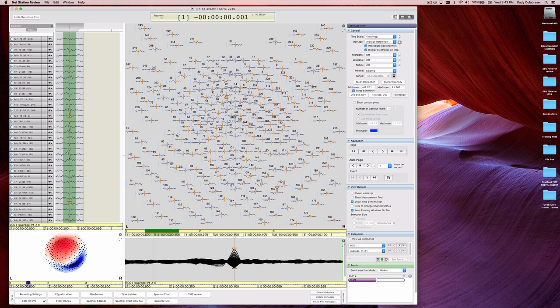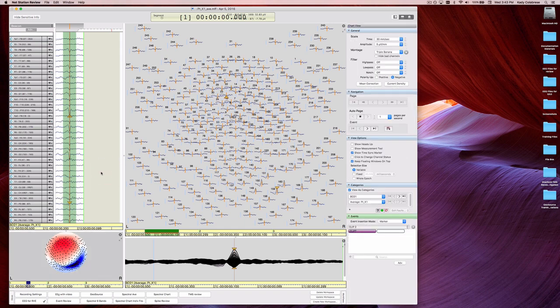Click on Chart View to make it active. The reciprocity visualization environment will pull the EEG data from this default chart view to make the calculations. It will send the following information: data for all the sensors. Sensors marked bad will not be used to compute the scalp interpolation or source calculations. All the viewer filters, and the mean correction setting.